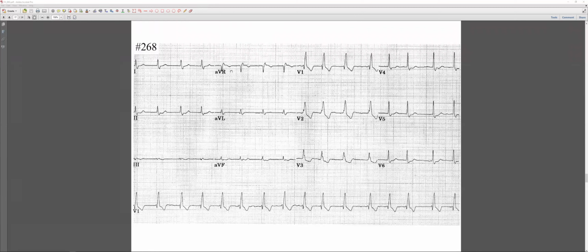Yes, you are controlling. So, firstly, we can see that it is arrhythmic. Very good. I cannot see any P waves. So, because it is arrhythmic and there are no P waves, we have atrial fibrillation. Correct. Very good.